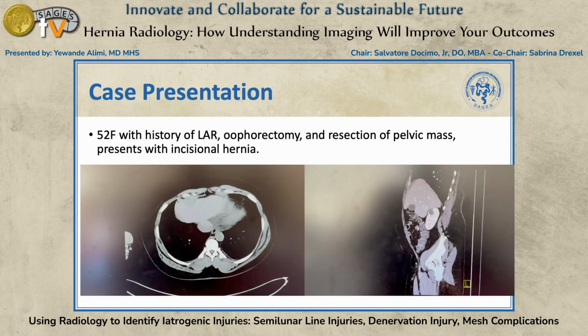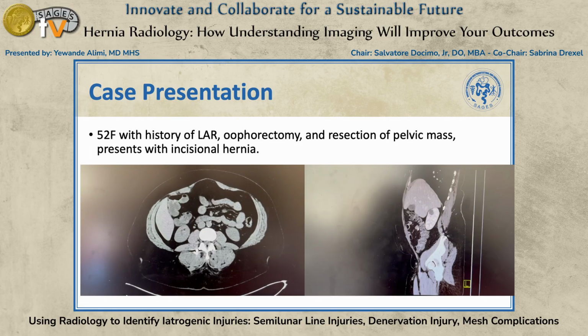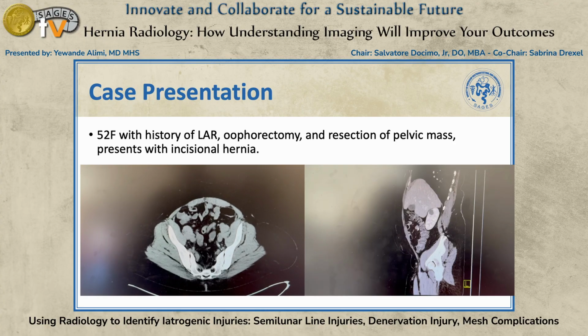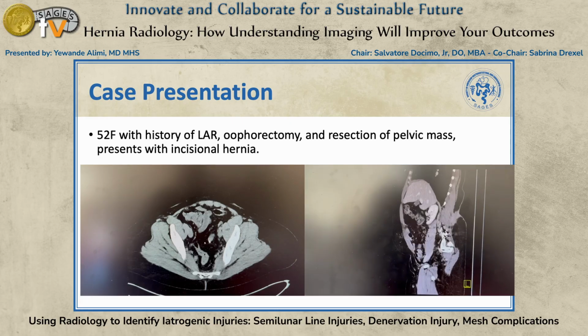This next patient is a 52-year-old female who had a prior LAR and oophorectomy and had a resection of a pelvic mass and presented with an incisional hernia. She was actually really quite symptomatic secondary to this hernia at her prior extraction point, which was done in the midline. You can see she has a defect that's mostly fat-containing on this CT scan.